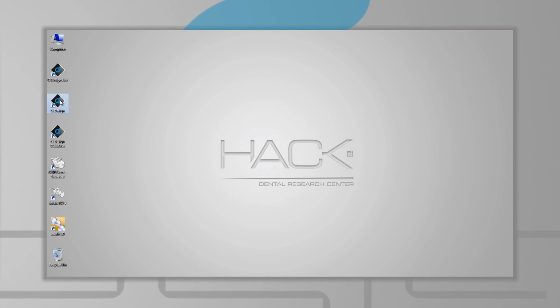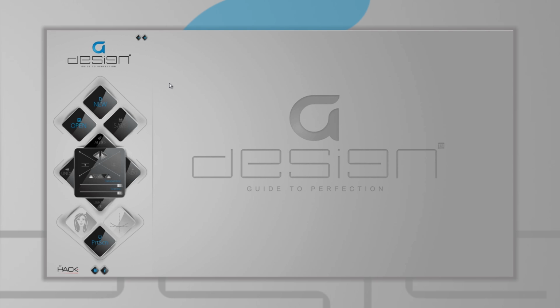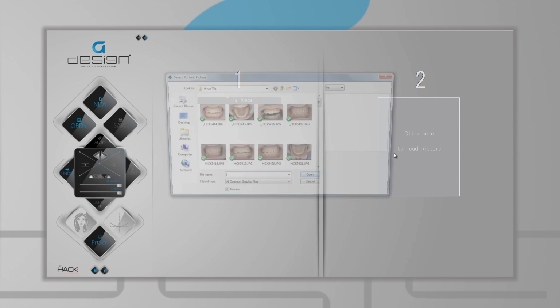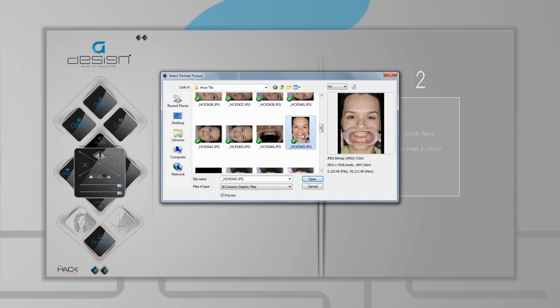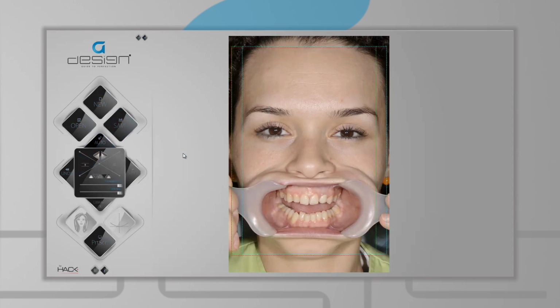Launch the G-Design application you have installed on your computer. Press New to start a new project. Box 1 should contain the patient's name. In Box 2, please load the patient's portrait photo. Press Auto for automatic detection of the pupils.